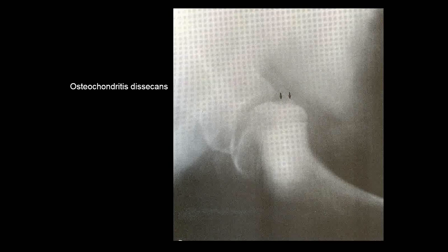Sorry for the noise here. The new digital radiographic machines tend to show these much better than the old machines did.